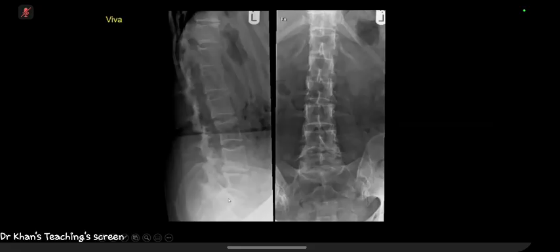So I'm presented with frontal and lateral radiographs of the lumbar spine in an adult patient. On the lateral projection, I can see posterior scalloping of the vertebral bodies. There's also some destructive change to the lamina from level L2 to L5. Having a look at the frontal view, there appears to be some lateral displacement of the pedicles.